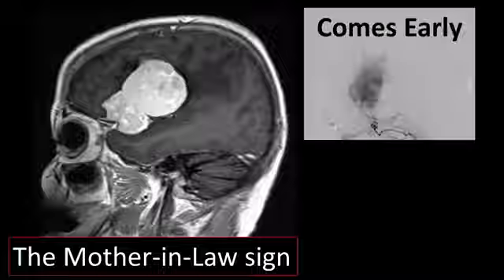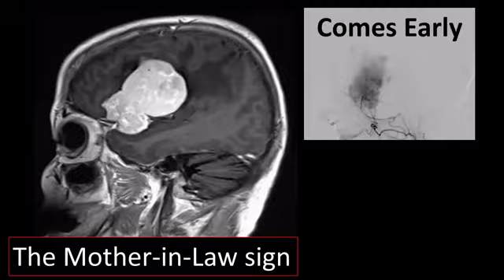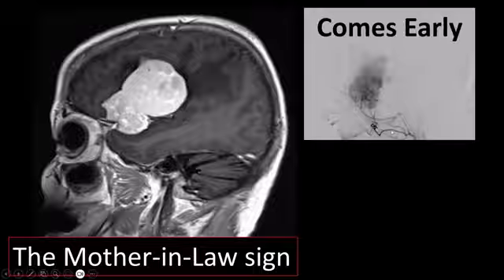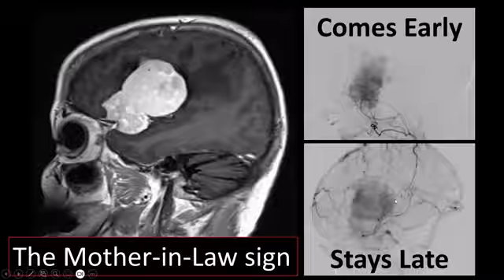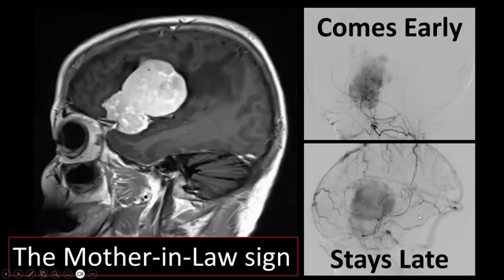And what is the mother-in-law sign? It basically means that if you do an angiography, and here we see an angiography, sagittal images, these are external carotid artery vessels, with the angiography made from within the external carotid artery. We see an early contrast blush. So this blush comes early, but it also stays late. We are now looking at images in the venous phase, and we still see an intense blush. So this pattern, an enhancement on angiography that comes early and stays late, is by some people referred to as the mother-in-law sign.